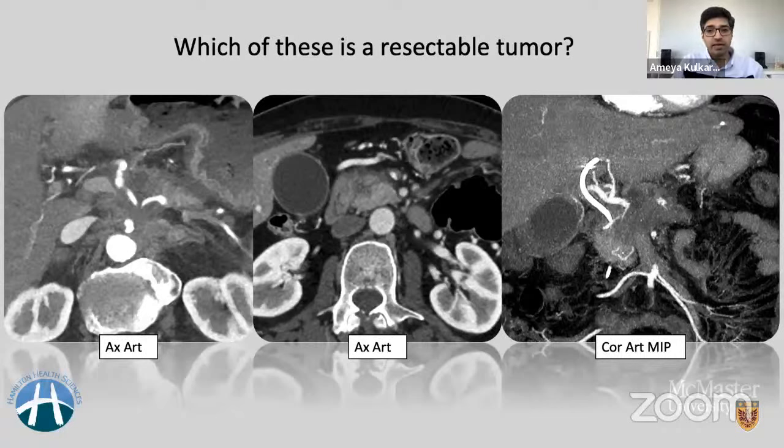Despite all of these things, the assessment can be fairly challenging because a large portion of tumors can have a macroscopically undetectable tumor around the blood vessels in the upper abdomen, which is nothing but lymphovascular invasion and perineural invasion, and that renders those patients quite high risk for local recurrence or distant metastases even after a surgical intervention.